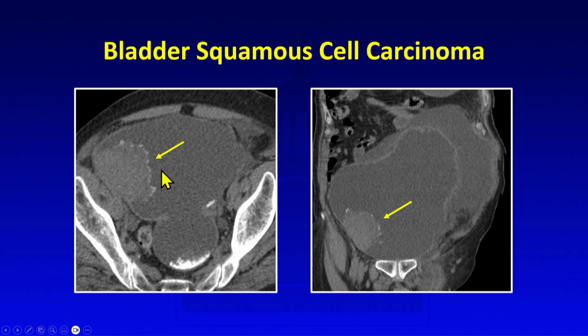And then on the right lateral bladder wall, we have this polypoid mass with some calcifications along the surface. And then in this patient, he actually came in with contained bladder rupture, and that's why there is this collection along the superior aspect of the bladder.